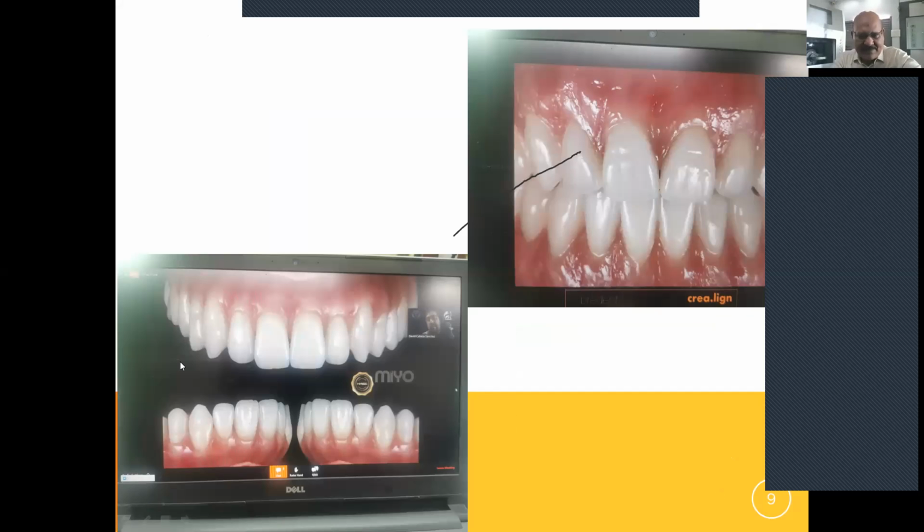These are teeth also from Bredent, which I used. So I took the library of teeth and inserted it onto the denture base. Once the denture base is milled and ready, then we can insert those Crea-line or Nova-line teeth. This is from Bredent.